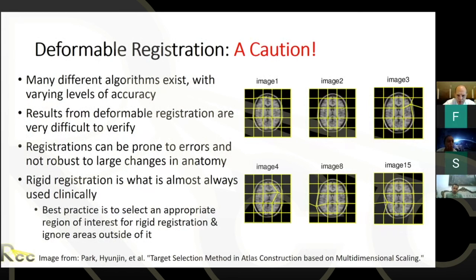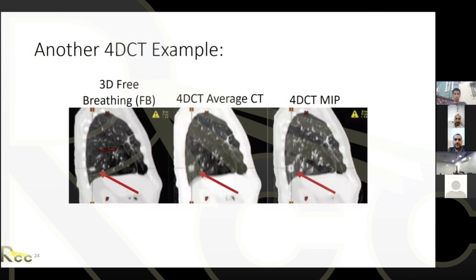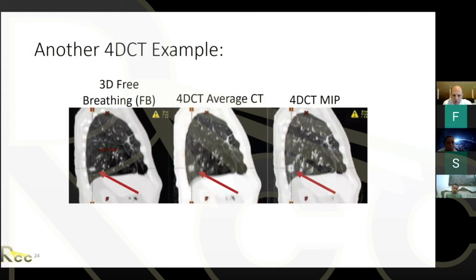I think that's better to show the concept of GTV, because with the vertebra, we cannot really see the difference between the GTV and CTV, like how that part was the GTV. Yeah, so I think this gives a clear definition.